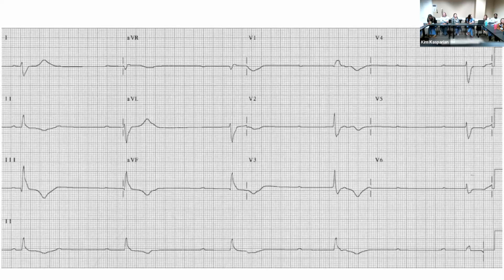And then one that is a little less controversial. So clearly very slow, right? Also notably, the QRS is long. So wide QRS tells you maybe we're not conducting through the His-Purkinje system, and maybe our ventricle is actually doing the pacing in this case.